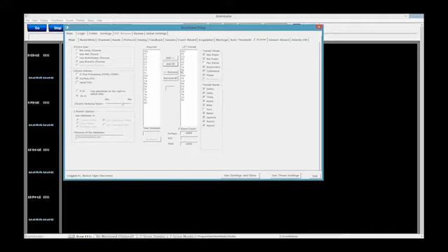When it comes down to standard surface style Z-score training, the most important thing to say is ZOK and ZOK-UL, which are the same, except ZOK-UL has an upper and lower threshold. Any changes you make to your protocol, always double check your Z-scores and make sure they're set properly to what you changed to. If you're doing 19 channels and you're not getting the right results, double check that you have 19 channels checked. Okay?